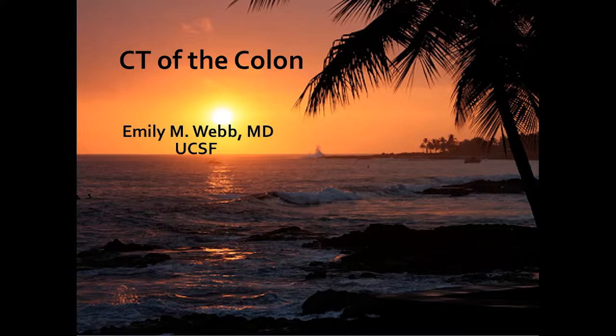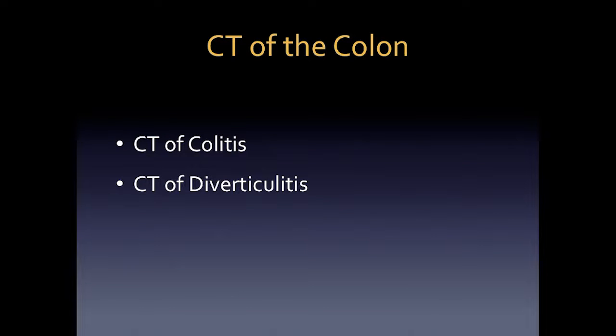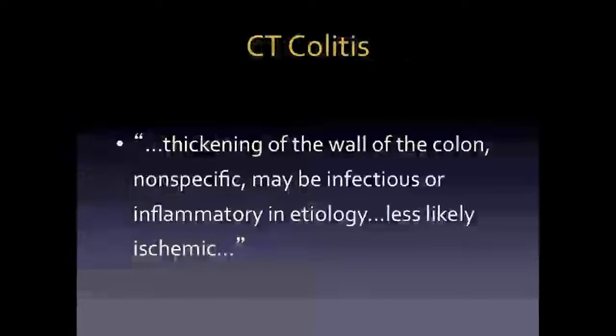Hello. This next talk will be on CT of the colon. Specifically, I'm going to talk about CT of colitis and also a little bit about CT of diverticulitis.